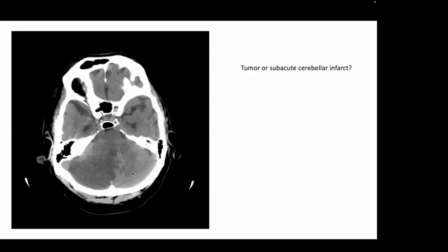Now, here's another pitfall you'll see in posterior circulation ischemia. People will see a scan like this and they see there's low attenuation on the CT scan. There's mass effect. It looks like a tumor in many respects, but this is in a sense a pseudotumor. And this swelling that occurs with posterior ischemia is different in terms of clinical management, because of the tight compartment of the posterior fossa with the tentorium forming the top and the foramen magnum at the bottom.